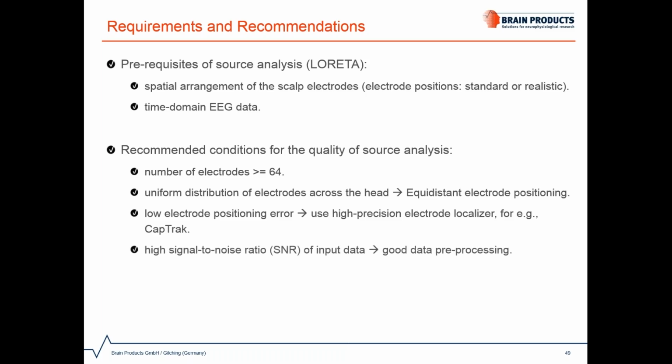Last but not least, as in any kind of scalp level analysis, for example ERP analysis, source analysis also benefits from a high signal to noise ratio, which can be achieved by having well pre-processed data. Okay, now let me go back to Analyzer and demonstrate the experimental data.